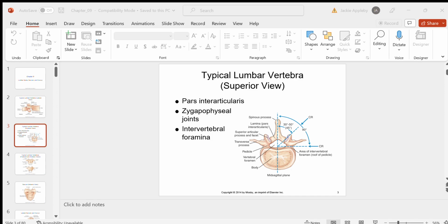Okay, let's take a look at one radiograph real quick. You won't see an outline of the spinous process, it'll just appear as a straight line. Well, I mean, you do kind of see an outline of it because it's thicker on the sides, it's thicker laterally. Okay. But here are our spinous processes. Those are all our spinous processes. Now notice they aren't perfectly midline, okay?